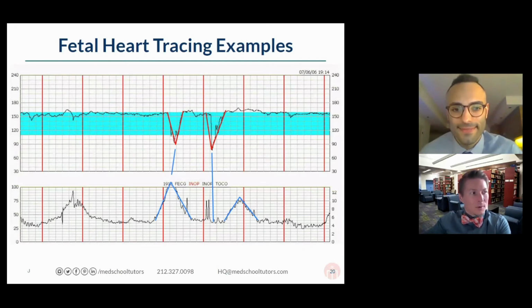All right, cool, excellent, nice. Great job, guys. Lots of answers saying cord compression. So yeah, usually we're looking at umbilical cord compression.